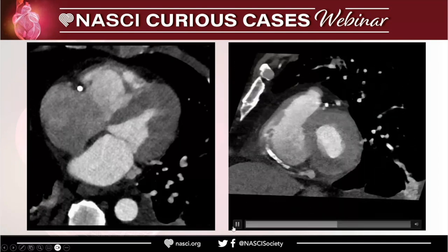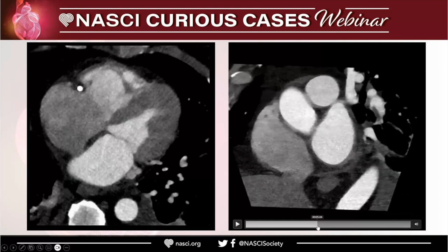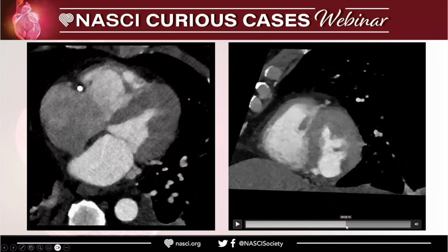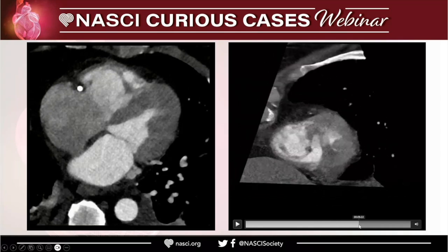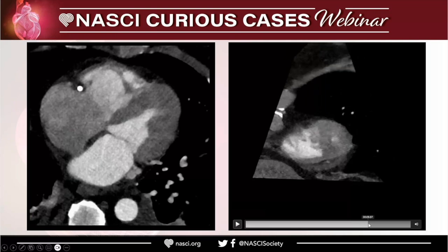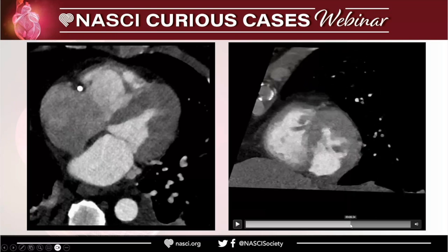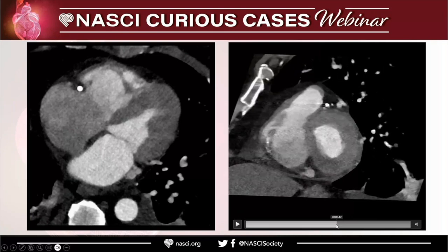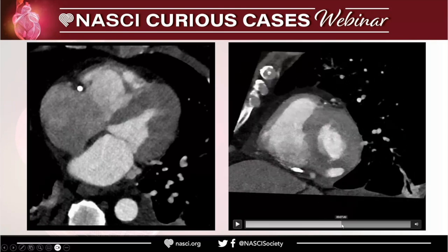I can go slow, so I'll go slow from here. So this is a known acute myocardial infarction.